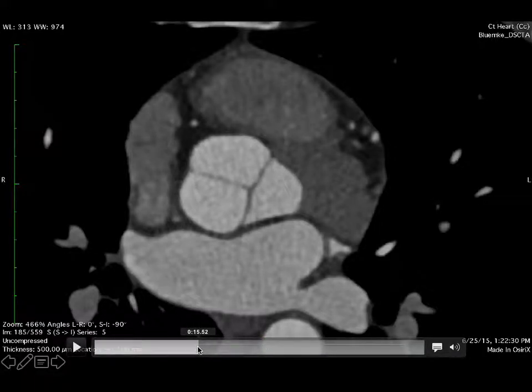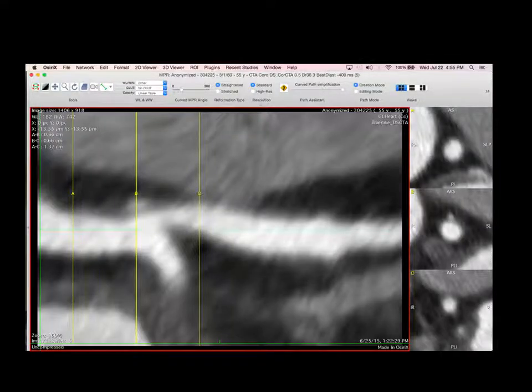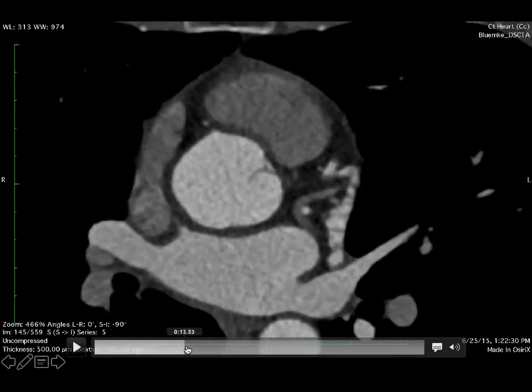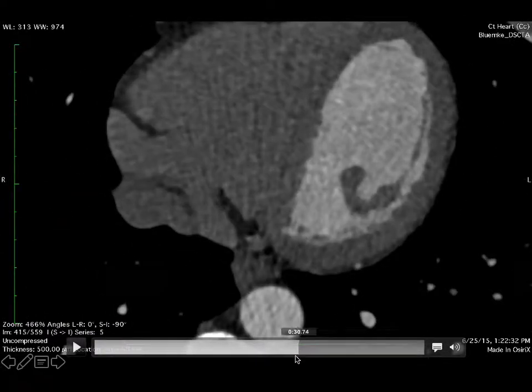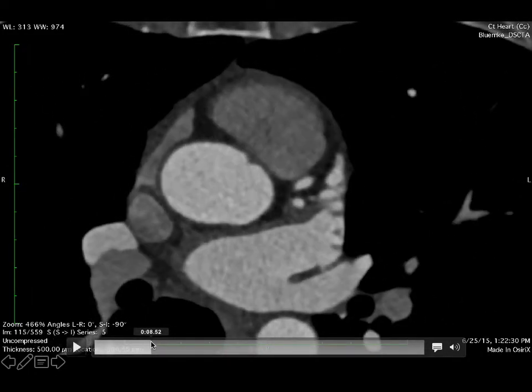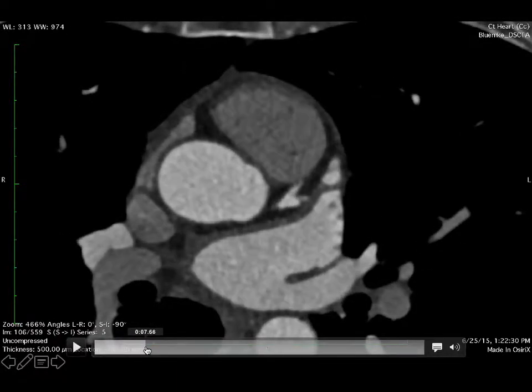And interestingly, radiologists and cardiologists that read these, they do it in this plane. This is an axial plane, so it's in the scan plane of the scanner, right? And they just zoom up and down like this. They go down and they come back up, look at stuff, and then if they're looking for a vessel that's narrow, they just track it as they push through the stack of slices. And so they'll track that vessel as it goes down.